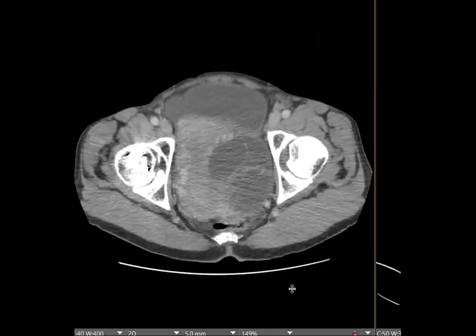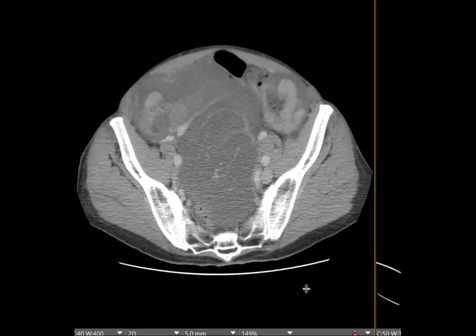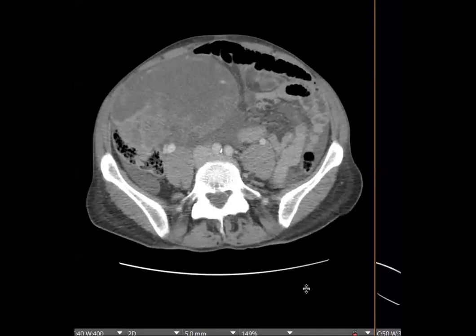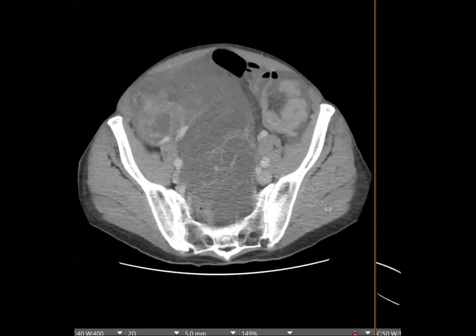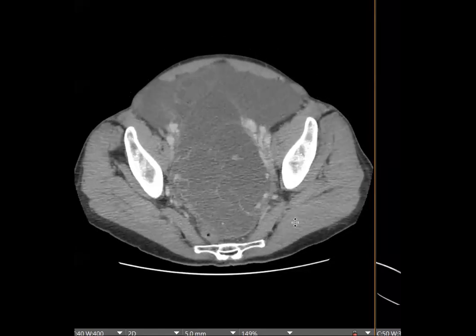It's like ovarian in origin because it looks like a thick-walled, enhancing septate mass. Excellent. It makes me think of a mucinous cystadenoma. Okay, excellent. On the right track. These are seen on both sides. So what do you think of that? So you're thinking correct. These look like they're ovarian. They could be mucinous.